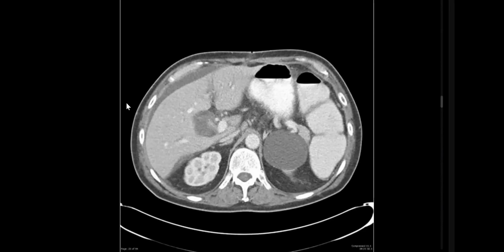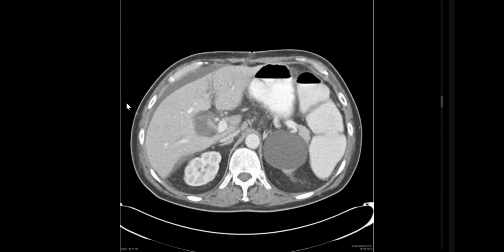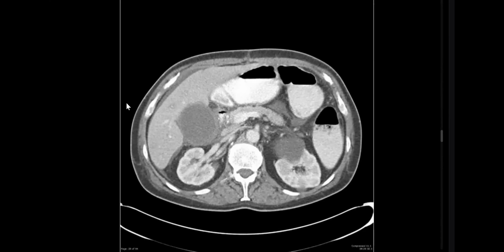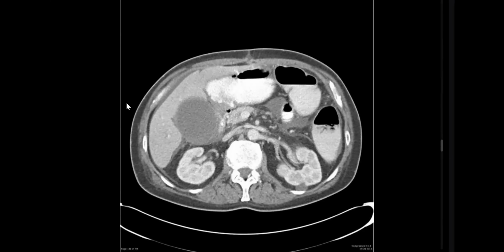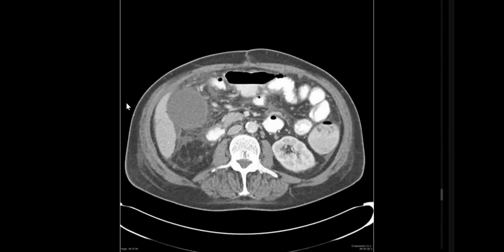I should convey this to the clinician and surgeon and the interventional radiology to insert maybe a tube. If the patient is operable, or surgically fit, cholecystectomy can be done. If old age and unfit, cholecystostomy. Then I mean interventional radiology. You mean this one, okay? Very good, my friends.